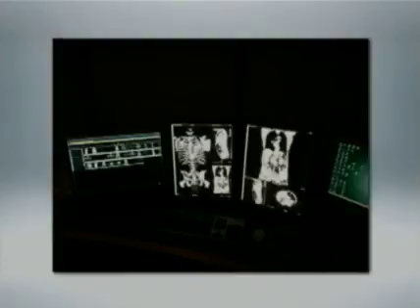And here's an example in the CT world of one of our PACS workstations. With one menu selection, I can fire up the post-processing software and do all the reconstructions I want and save them as part of the original acquisition.